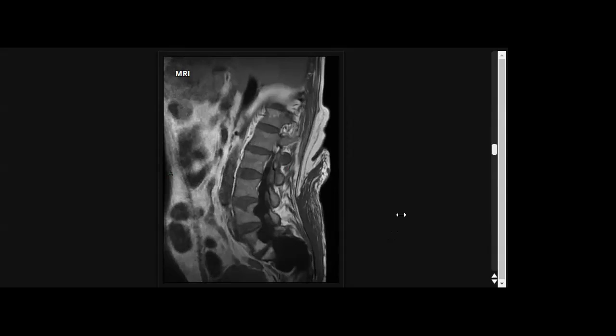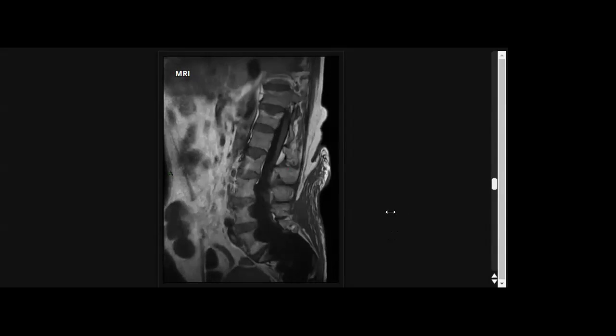A question to you: what are other differential diagnoses of posterior vertebral scalloping? It could be any intraspinal lesion, like myxopapillary ependymoma, which we have just seen, or any other lesion like neurofibroma, which is causing the scalloping. It could be seen in acromegaly, and it could be seen in achondroplasia. And these are the differentials mainly for the posterior scalloping of the vertebral bodies.